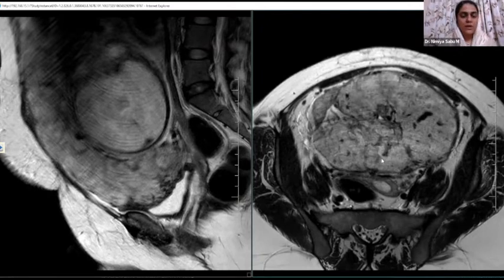The superior part of the placenta appears to be extending along the anterior abdominal wall. The margins of the placenta appear to be irregular. However, the hypointense area of margination between the placenta and the bladder appears to be maintained in the image given to me.